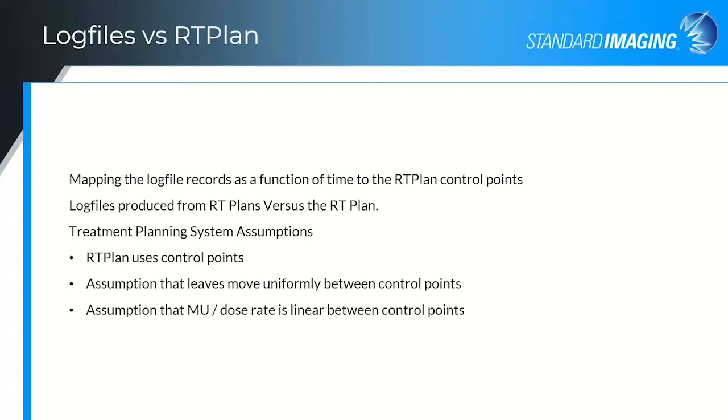And as an extra step, if one is interested in investigating further and wants to look into a specific plan delivery error, one can generate an RT plan with different numbers of control points and can map the actual delivery more closely than the delivery assumed and sent from the treatment planning system, just to go back and cross-check if there was a delivery error.